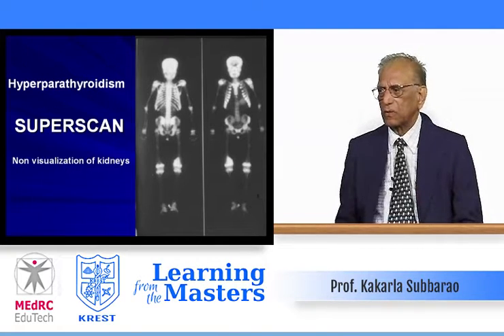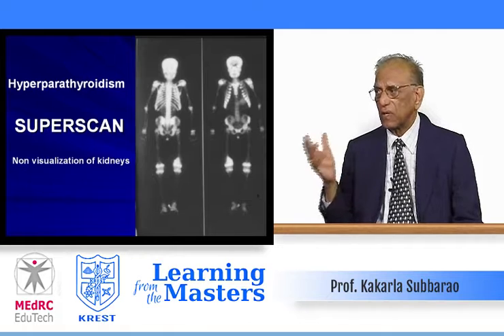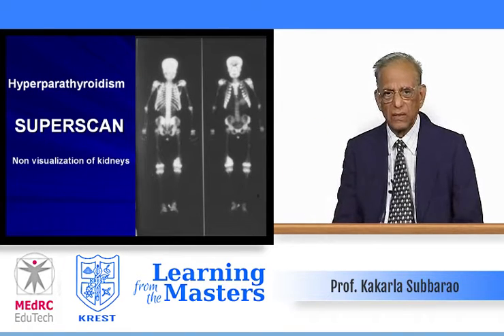Again, renal osteodystrophy with secondary hyperparathyroidism. In fact, in secondary hyperparathyroidism, we are seeing more and more brown tumors. And then vascular and soft tissue calcifications are also seen in the hand.